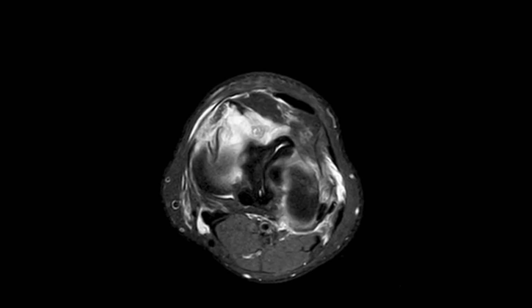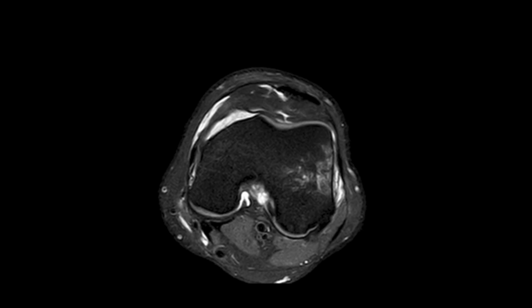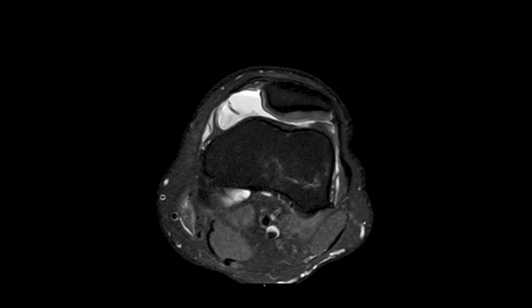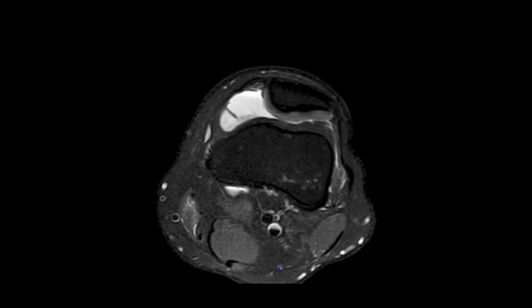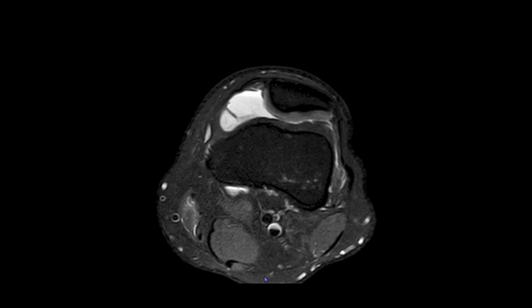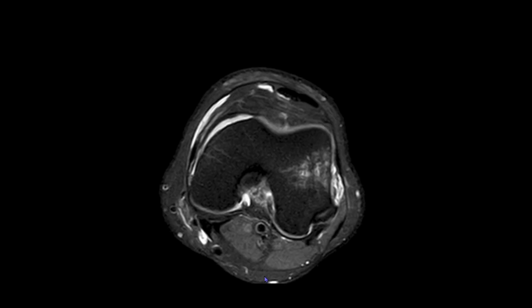And looking back at the medial aspect, the tendons, when we trace, this would be the semimembranosus, and on the medial aspect we would be able to trace the semitendinosus. So semitendinosus, gracilis would be there, sartorius would be there. This would go on and insert onto the proximal aspect of the tibia.